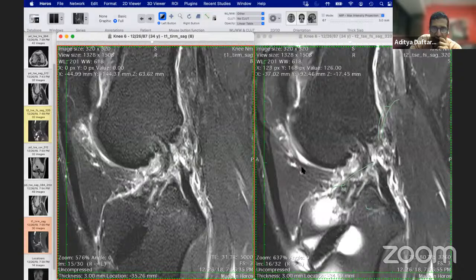How far will a repeat MRI at 6 weeks be helpful to say? When you talk about healing, I think that's an important thing to remember: all we are looking at on MRI is how good the quality of collagen is. As the collagen quality continues to get better, we will see these structures darker and darker. As the quality of collagen gets worse, we will see these structures hazier and brighter in appearance. But to correlate that with the clinical presence of laxity or whether a structure has healed completely, typically, if you had an original image that shows something very bright and a later image that shows it's much less bright, then we would say it's healing well. But to say that it has healed completely, I would say only once I see it completely dark.